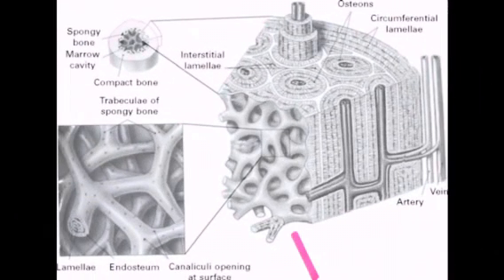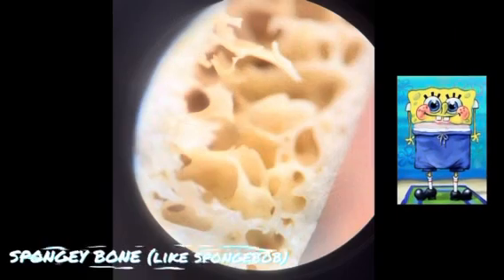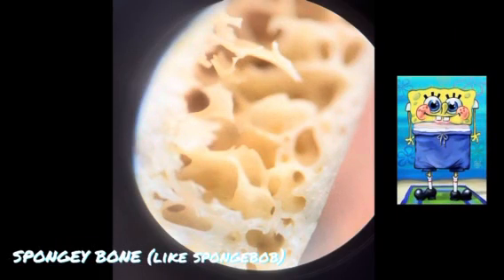Wow! Bone trabeculae are the supporting tissues that provide strength and structure to bones. Trabeculae are made up of columns and rows of connective tissue that form a web-like structure. A type of bone that we observed under the microscope is called the spongy bone.